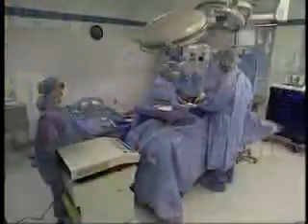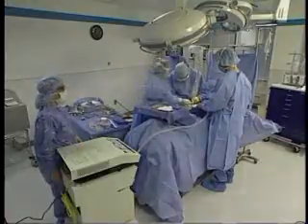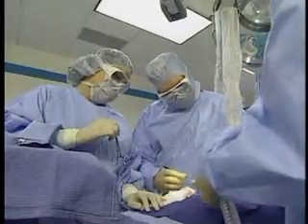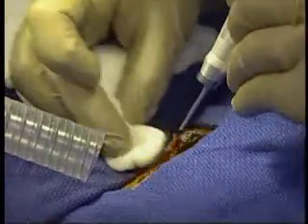Serious injury can result if settings are not properly controlled, protocols per wavelength not observed, or if the laser beam is inadvertently aimed incorrectly. Perioperative nurses should be familiar with unique features, operational aspects, and safety practices applicable to all lasers. The wavelength of the laser determines its unique tissue effect and dictates what safety measures are necessary.